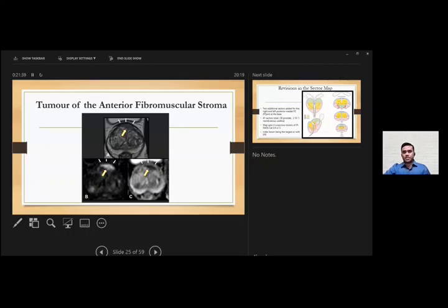Now, if such an area is showing hyperintensity on DWI and shows enhancement on dynamic contrast, then we need to look at it seriously and check for extracapsular bulge, because about 30% of all anterior prostatic cancers are missed on MRI.